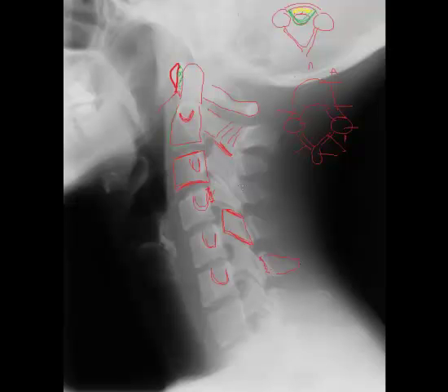Now, you all will notice this very conspicuous white line here on the posterior arch of each vertebra. This is the spinolaminar junction. This is actually the junction point between the lamina and the spinous process. Because the bone is so thick in that location, it's very radiographically dense, and so we see that line very well. If that line is not visualized, let's say on this bird's eye view, there's a midline defect, there will be no radiographically visible spinolaminar junction. This is called spina bifida occulta, and it is characterized by a midline defect at the posterior arch. There are more serious types of spina bifida that will have protruding contents through that cleft and are surgically repaired. However, the occulta type is usually not detected simply because it's typically an incidental finding.